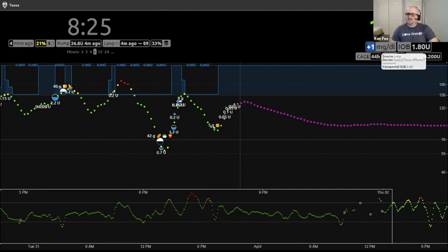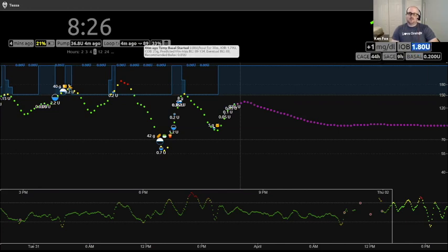All right, insulin on board. We've talked about what that means in the last video, but it's usually pretty accurate. This pill is usually accurate, but if you're not sure, you always come over here to the Loop app, Loop pill. You can see that the IOB is actually 1.79 units, but the IOB on the right shows 1.8. So they're usually pretty close. But your source of truth is the Loop pill.